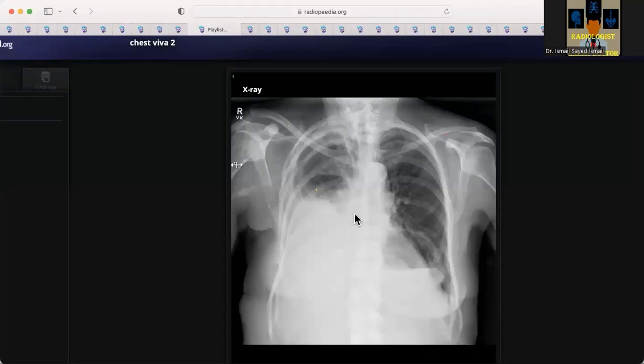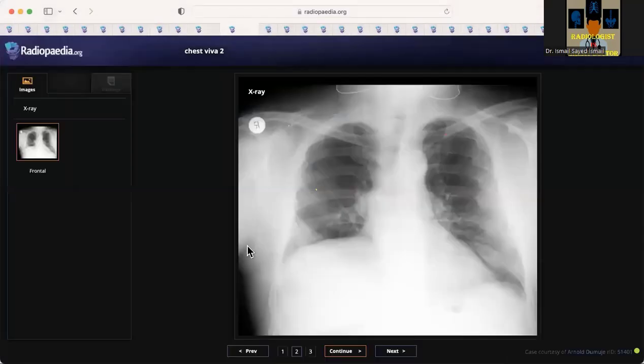Okay, and management-wise, what would you do? First, I will immediately call the referring doctor and put her in a fast track chest, abdomen, and pelvic CT scan with IV contrast, and have it discussed with the breast oncology MDT team. Yes, so she will need restaging. They call it a restaging scan. So you'd say to the examiner that this patient would require restaging and a rediscussion in the breast MDT. Okay, so well done.